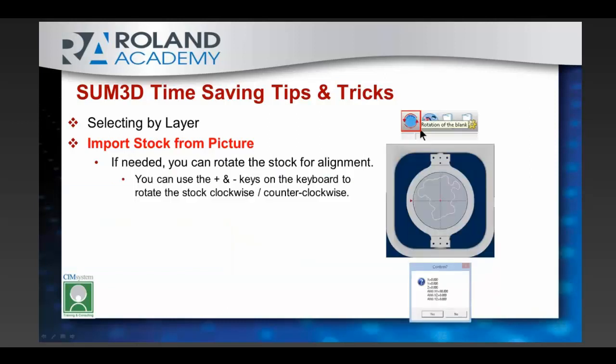And then this is the slide that basically talks about, again, if needed, you can rotate the stock for the alignment just to make that line up with the way that you took the picture.